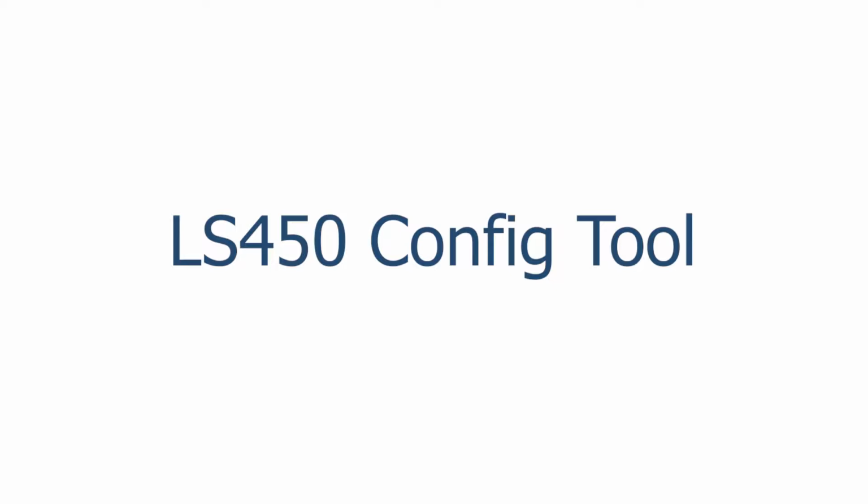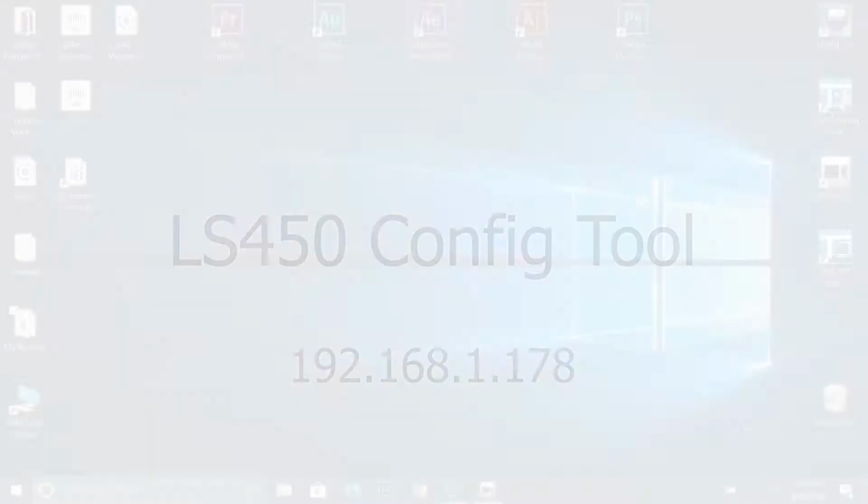Begin by confirming that your laptop has a static IP address of 192.168.1.178. This is the IP address that the system requires for communication. If it is not set, refer to the beginning of video 3 to learn how to do this.